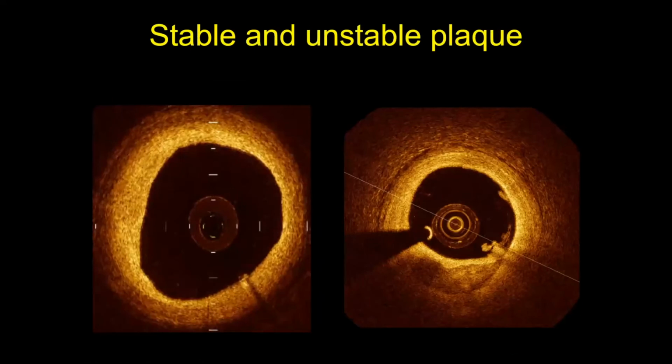So that's what we are saying, that you can appreciate what kind of plaque it is. It's a stable plaque on this side, and as we were saying, part of it is that you have to see these things repeatedly, and it's pattern recognition. Those four points that I've told you, on the basis of that you differentiate these things.